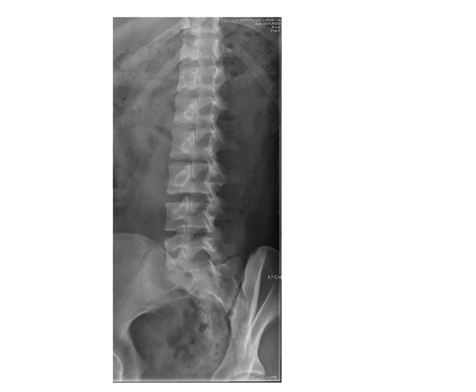There's also another trick I'm going to talk about that a lot of radiologic technologists use, which is called the Scottie dog symbol, which is created by the distortion of the structures of the vertebral body and the structures projecting off of the vertebral body. All of those structures make what's called a Scottie dog type of shadow on the image itself. So I'm going to identify that, and we're going to look through the anatomy and talk about positioning of the patient.